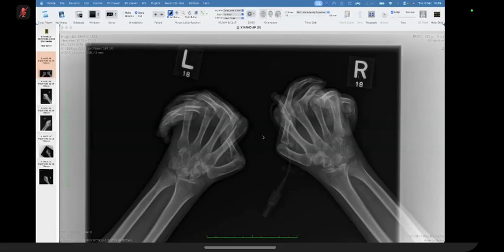Yeah, it's not moving, but tell me where you see these erosions. I'm interested in seeing the erosions. Okay, I see this. I think this area. It's the interphalangeal joints, the metacarpophalangeal joints, the articular surface of the proximal phalanx is not clearly seen in this joint. Okay, so we'll come back to this one.